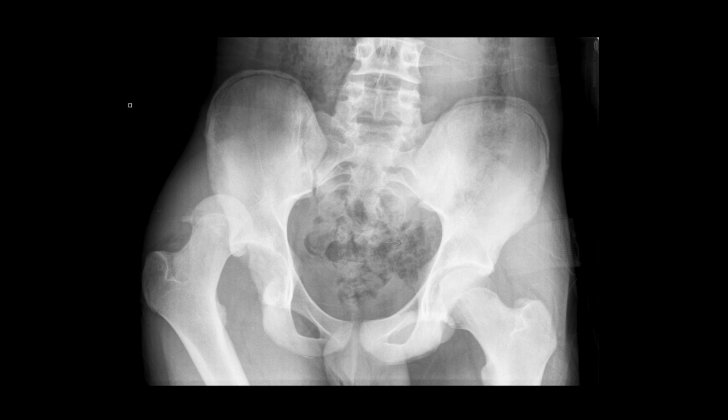Right, so hopefully you've had a go at going through the system that we've described to point out what you think will be the problem. Again, looking at the alignment, that looks good to me. Tracing the pelvic inlet, we're fine there. The rings as well are fine. And tracing the borders of the pelvis is fine.